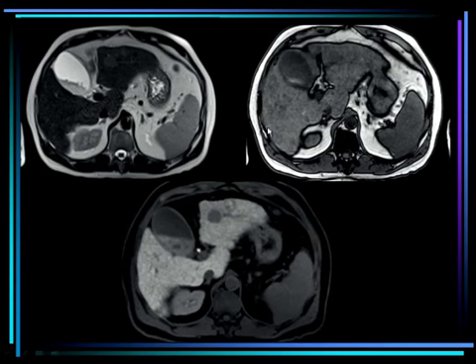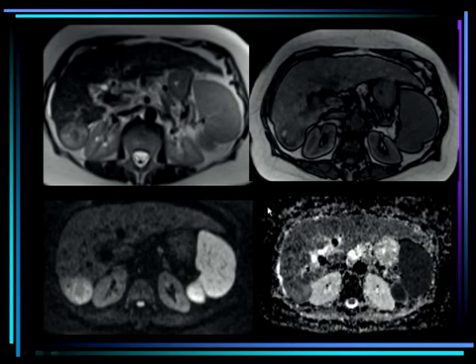What happens today is that we have those which are called hepatocellular directed contrast agents. Now you have a T2 weighted image, again, the liquor is white, so this is a T2 weighted image. You have the liver, you have an atrophy of the segment 4. You have irregular surface of the liver. So we deal with cirrhosis. You might be able to see on T2 weighted image this little lesion. On T1 opposed phase it is not very easy to see, but using this hepatocyte contrast agent 20 minutes after injection, you see the liver is enhancing and this lesion is not enhancing. So there are some criteria where you can say this is hepatocellular carcinoma.